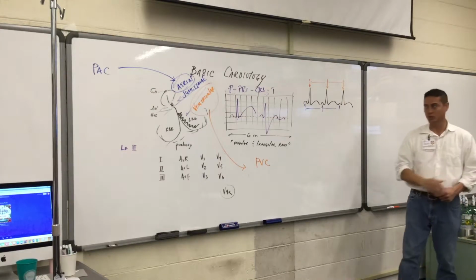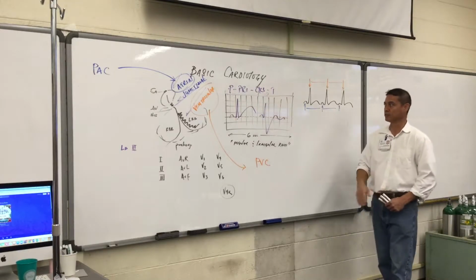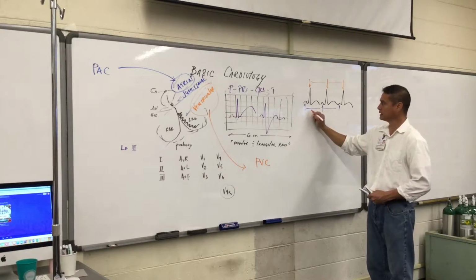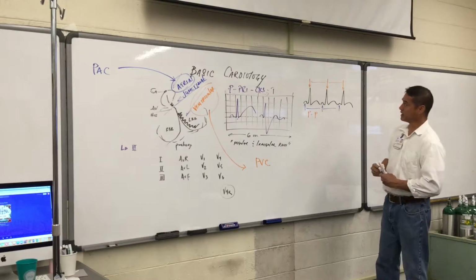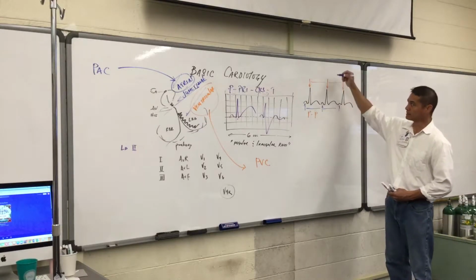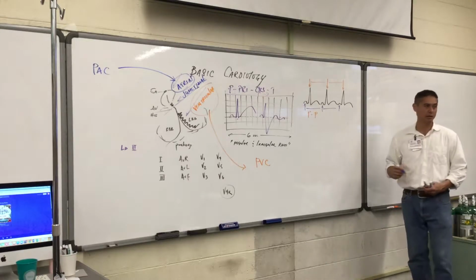So as we go over these strips, we have some criteria to rule out. Again, it follows this linear process. That's the first thing. As we go through it, then we measure this P to P interval. So P to P. And then we have, what wave is this? If we go upward, the positive deflection, the first negative deflection would be a Q. A positive deflection from baseline would be an R. And a negative deflection below that would be an S.